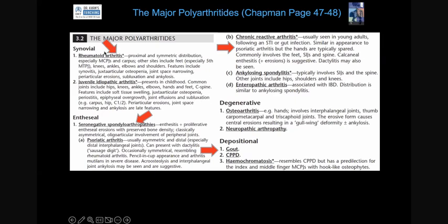Please remember that rheumatoid arthritis usually causes what we call bilateral symmetrical changes, which were visible in this particular case. Don't think that the word symmetrical means 100% symmetrical, but there are overall similar types of findings, right and left. Then come seronegative arthropathies. In seronegative arthropathies, chronic reactive arthritis is the one which you have to consider, and then there is gout.